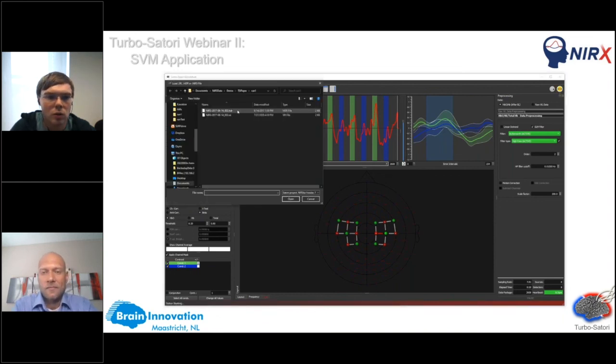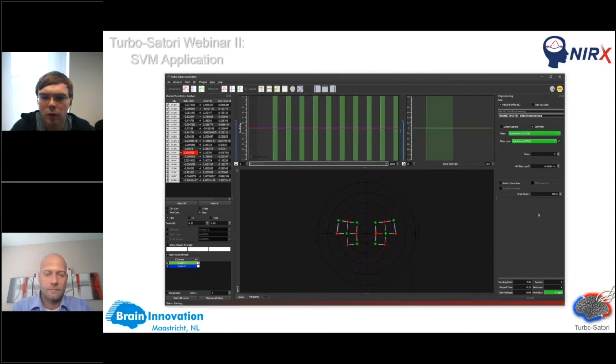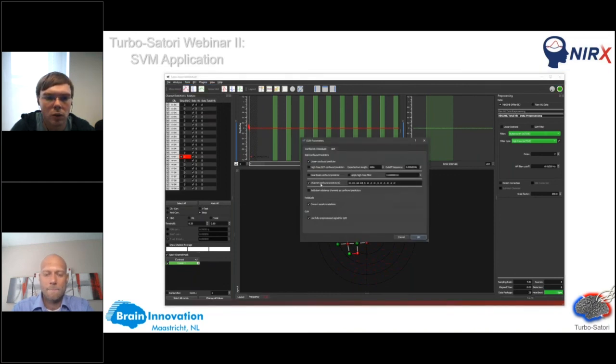Yeah, so I can show you just an example of how this could look. You have the option to run a localizer, which is basically just a way of getting this information. I should shortly exclude these confounds. If you have these confound channels selected, which were for another data set, you can just uncheck them.